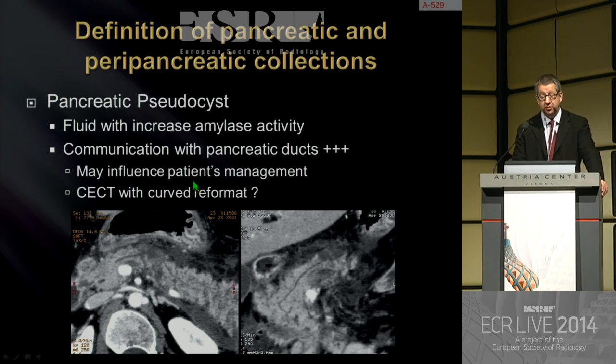Contrast-enhanced CT, of course, may be able to detect such a pancreatic disruption, but I have to admit that I took these pictures from a CT that I performed more than 10 years ago to be able to show you such a nice picture. Of course, CT in case of a non-dilated duct is not the best technique to make the diagnosis of rupture. MR by far is much, much more accurate.